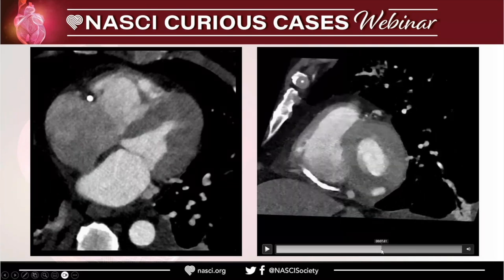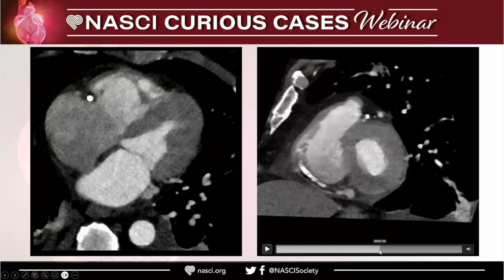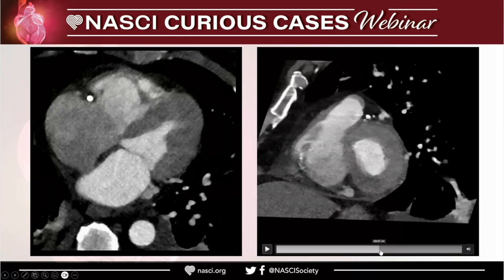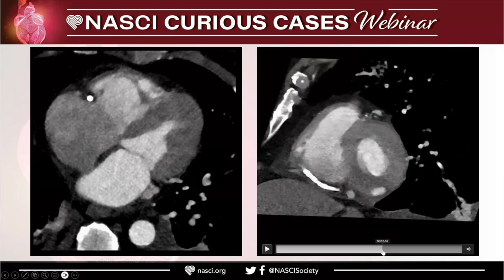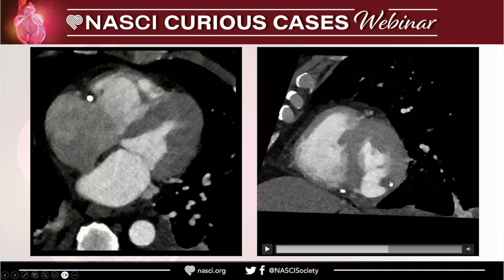Septal perforation, MI related? Yeah, so one thing that we see is hypoattenuation. There is definitely some hypoattenuation. I know it may not be projecting very well. You might want to window it, but believe me, there is hypoattenuation. And then this out in the inferior wall. Go ahead, Noha.